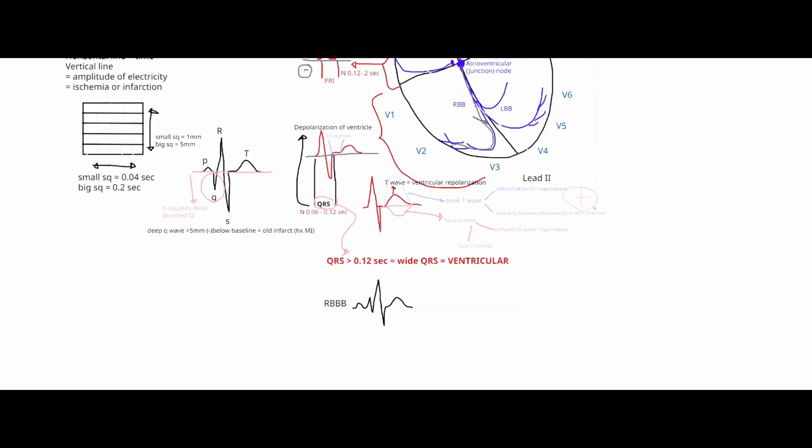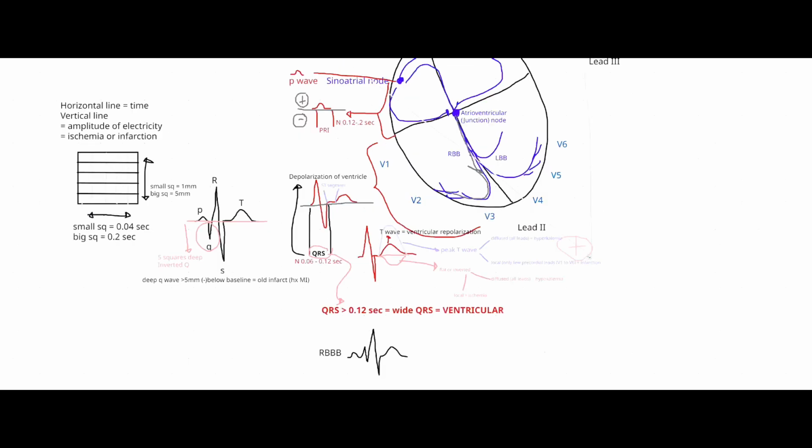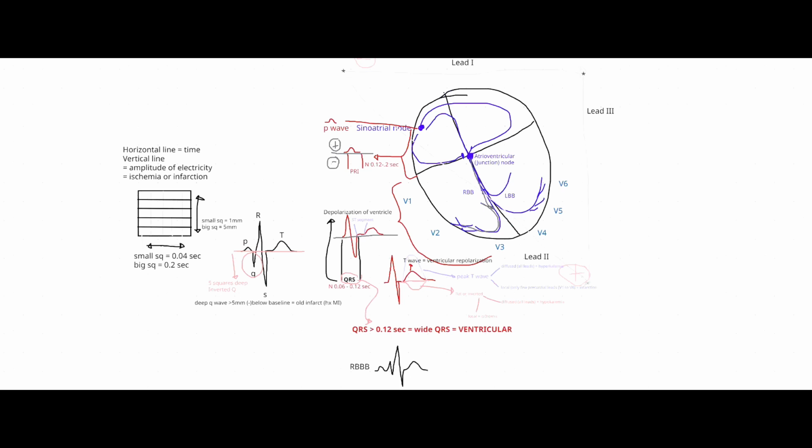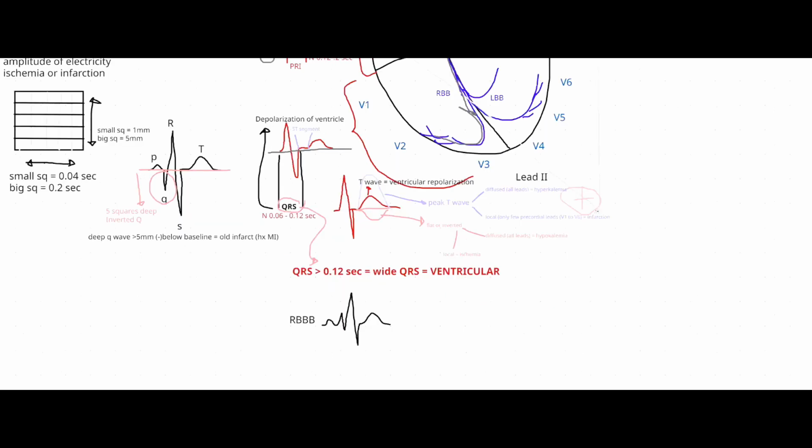And the bounce back is when it became negative. Because remember how I said the flow of electricity in the heart is negative at the top, positive at the bottom. So when it bounced back, when it went back like that, you see the wave go down. And then when it found a new route, which is going towards this way again, towards the apex, then you see it go up again. Okay, very benign, nothing to worry about.